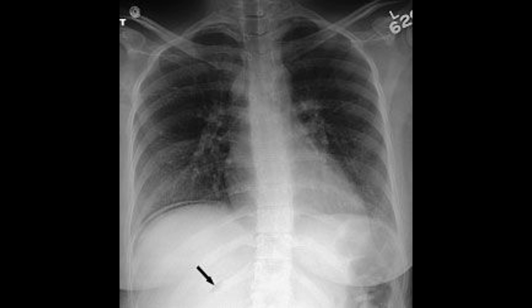In summary, these findings represent a pneumoperitoneum secondary to a perforated ulcer, demonstrated by a crescent of gas beneath the right hemidiaphragm and the Doge's cap sign, a classic, high-yield radiographic diagnosis that requires urgent surgical attention.